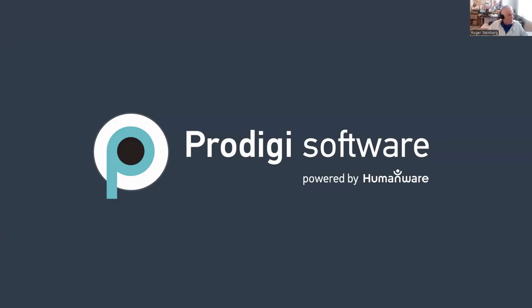This is HumanWare Live, and today's goal is to demonstrate for you the new features that are coming in the Prodigi for Windows software that will be released in approximately a week from today.